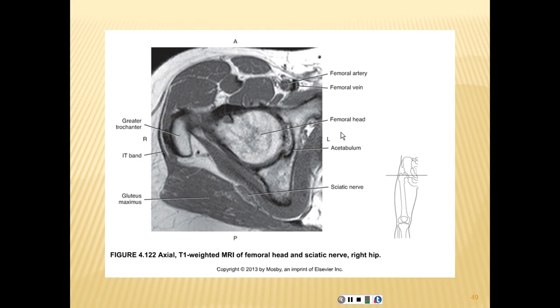So here we're further down into the pelvic region, and this is still including the spine. The sciatic nerve branches straight off of the plexus, and therefore is included in this discussion. So you should be familiar with all the anatomy.